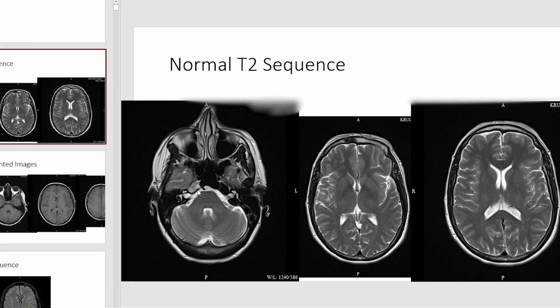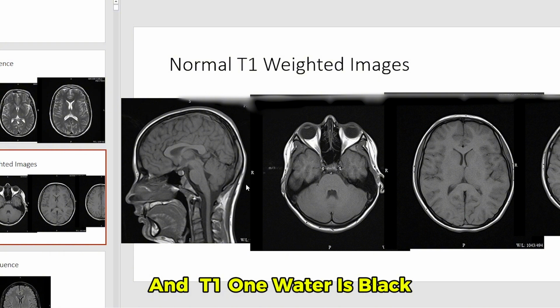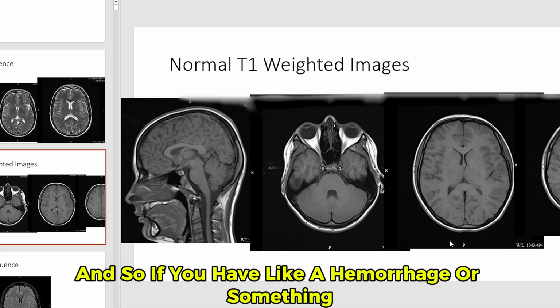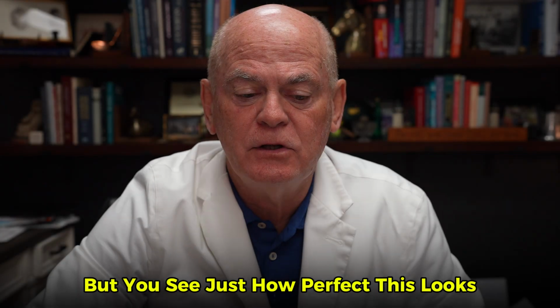This next one is the T1 weighted image, and T1, water is black. And so you'll see the same area that was white on the last one is now black. And so if you have a hemorrhage or something, it'll light up with different characteristics. But you see just how perfect this looks.